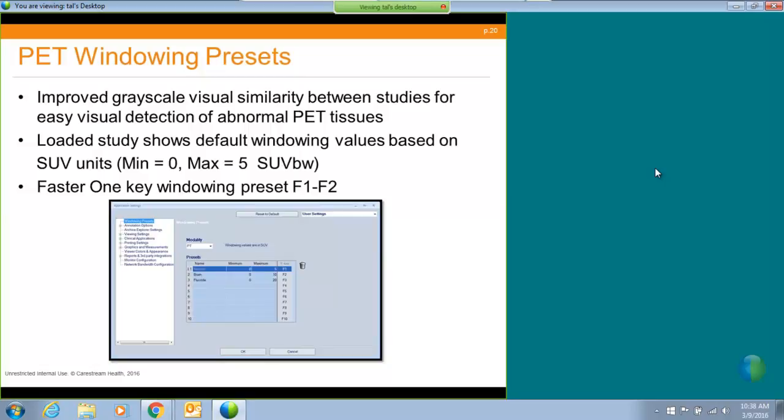And the DP, actually the layout, knows to look for the preset named normal and to switch to its windowing value. So you can change its values, but you can't change its name. And you can also add any other preset you'd like. So it allows you to window with one function key, like in any CT, but here in SUV values.